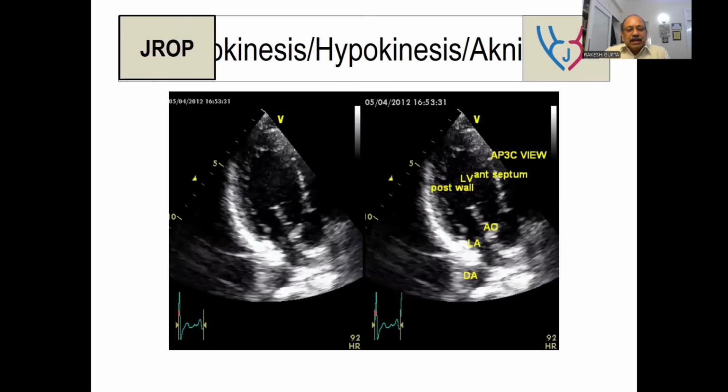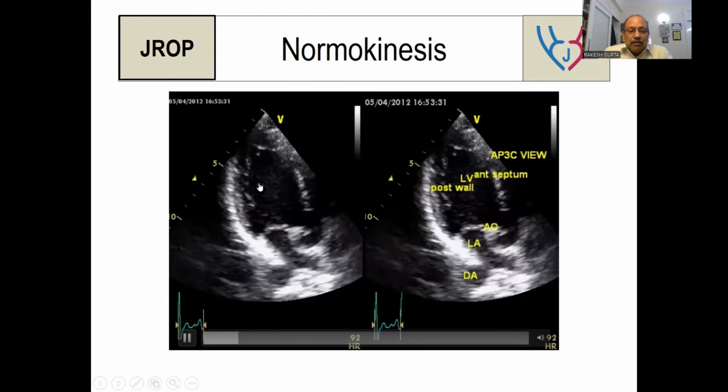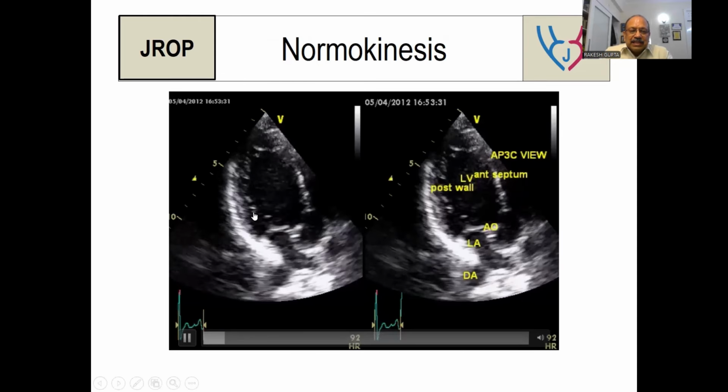Now, I'll go back to your previous slides. Now look at how much this endocardium is thickening. That is the most important thing for any of these presentations. Let me just show you in a different way again.